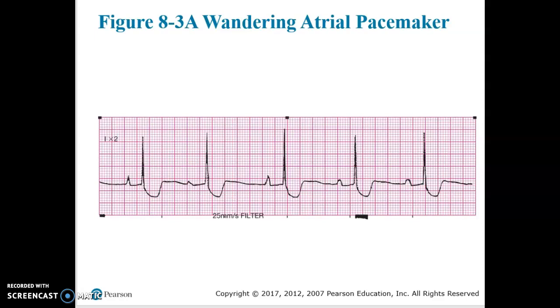So what is the first question? The first question that we ask ourselves is, are there QRS complexes? The answer here is we do have QRS complexes, and they are shaped the same.